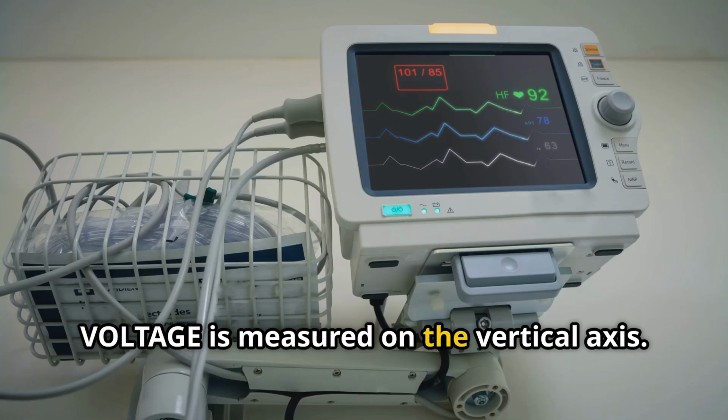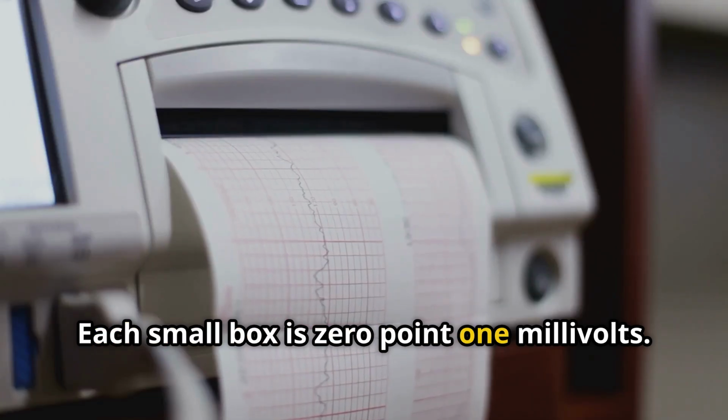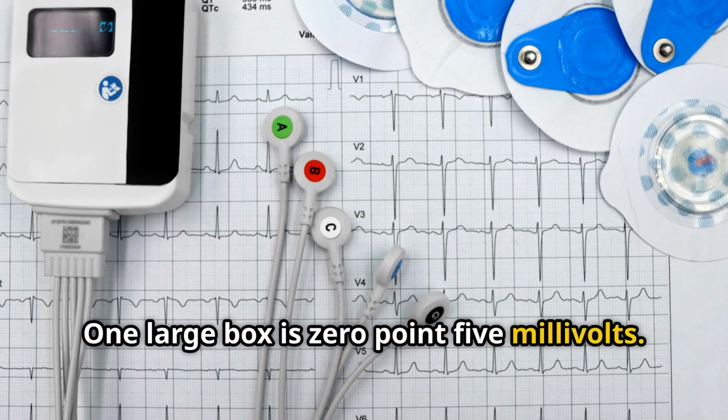Voltage is measured on the vertical axis. Each small box is 0.1 millivolts. One large box is 0.5 millivolts.